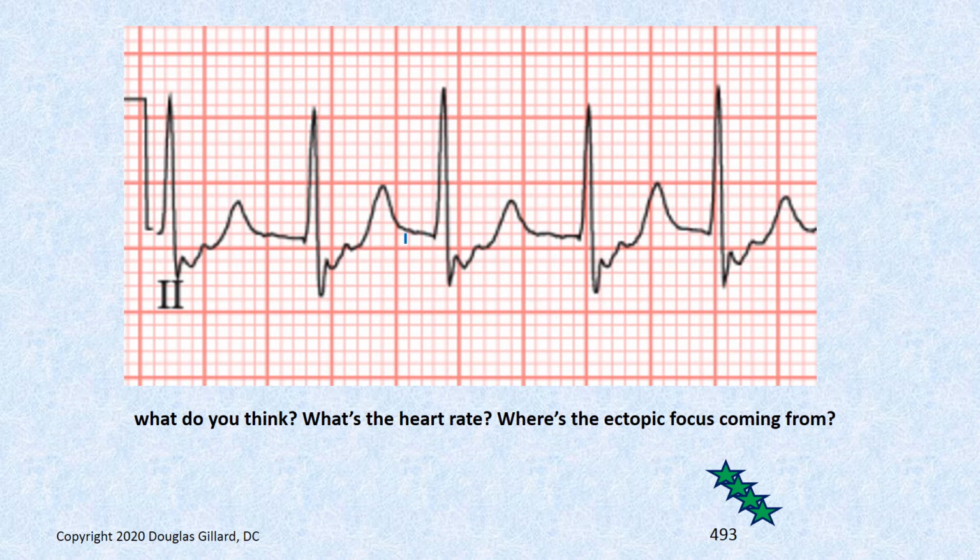Where's the P wave? I don't see it here. Oh, we got something funky going on here. There it is, right there. Right? So we got a P wave.